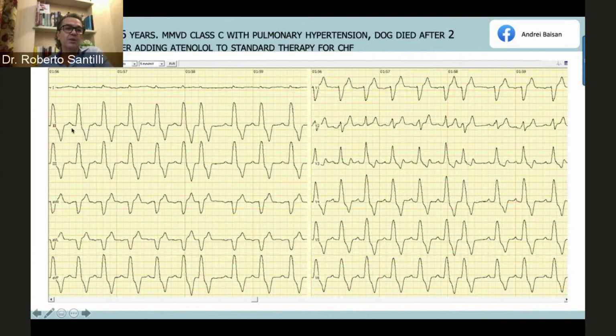So what happened here, we have to try to understand what type of intraventricular block it is, so what type of bundle branch block it is. And so we look at the axis. It's a normal axis on the frontal plane, and it has a normal axis on the horizontal plane, so negative in V1 and positive from V2 to V6. So this is a left bundle branch block.